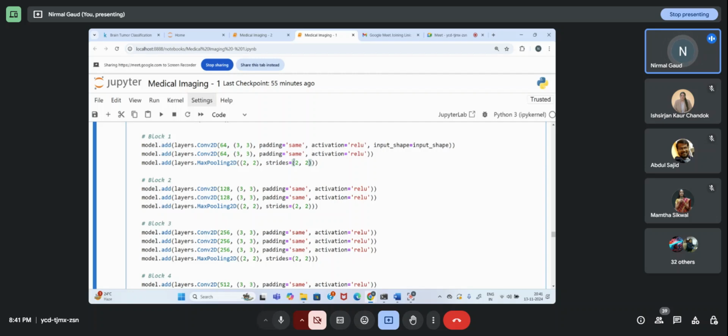So I want the shape of the image to be in a comfortable mode so that it is convenient to apply the filter over the image. That's why I'm doing the padding. And we are taking 0, as I told you day before yesterday, I'm filling the boundary with 0. So that is the padding. I will explain more on this.